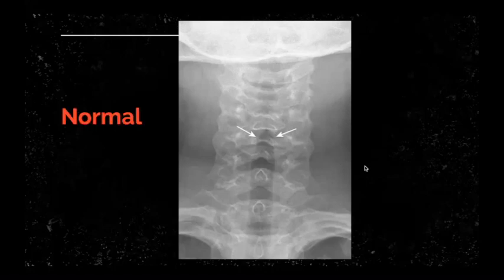So this is a frontal radiograph of the neck. As you can see, this is the trachea, if you can see my cursor here, right? It is expected to see some narrowing at the midpoint of the trachea or the upper part of the airway. So this is the glottic area. All right. What is most important is the subglottic area. It should be very spacious like this, and then it will show a shouldering here. So this is basically a normal frontal neck X-ray.